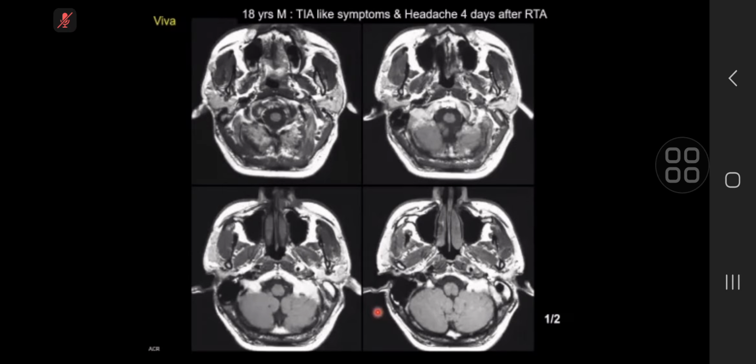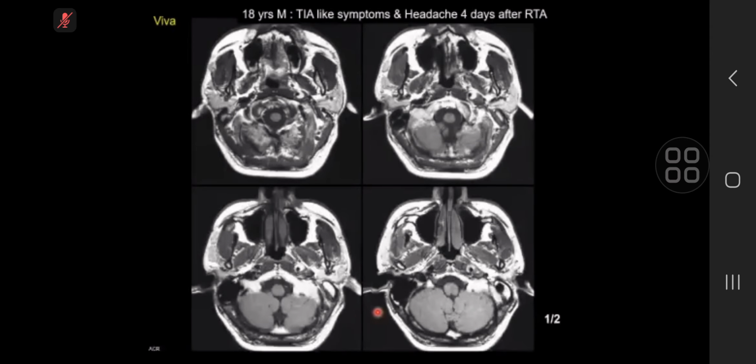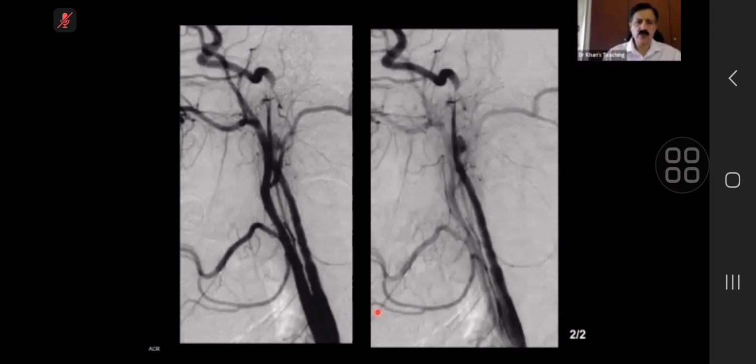I will look for fat-sat axial T1 sequence in particular. Okay. It is not available. What else will you do? CT also is helpful. So you're talking about the CTA, correct? CT angiogram. Right. So instead of CTA, I am showing you a DSA.